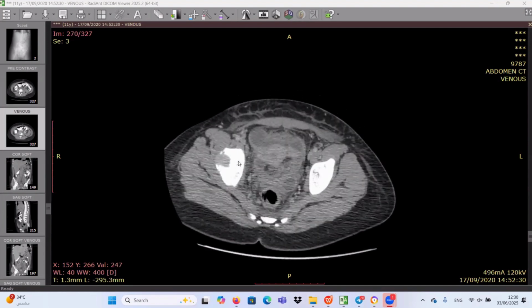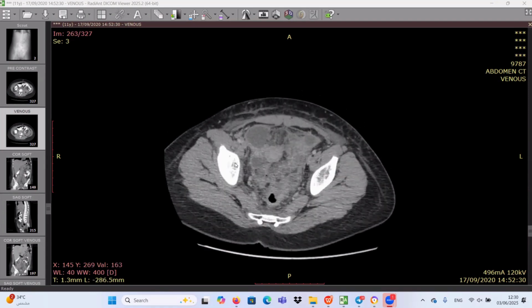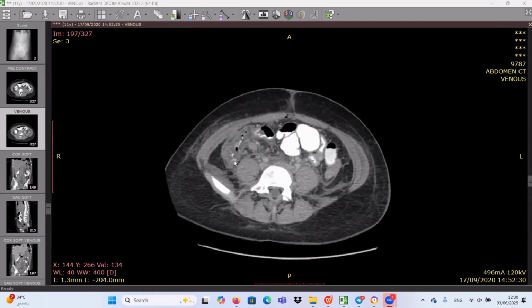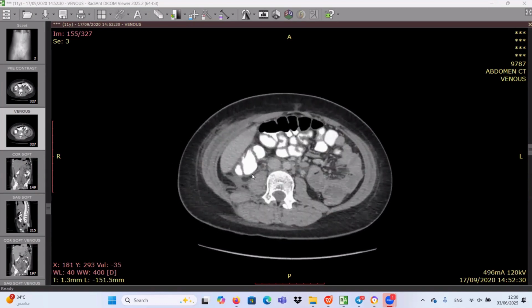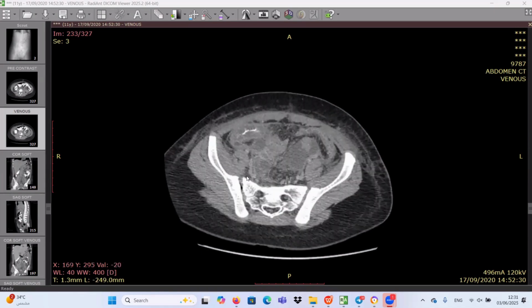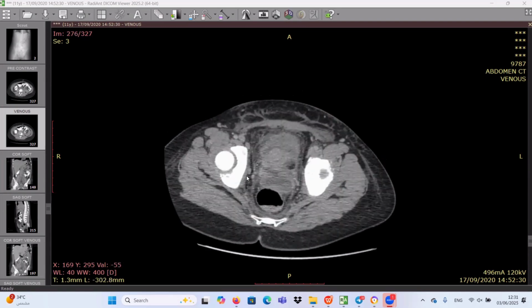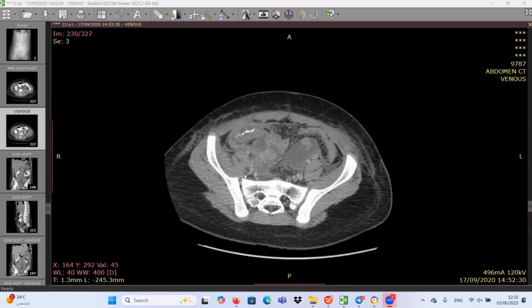Sir, I've heard that the uterus is in place, and it's a complex looking ascites, and I can appreciate a long segment thickening of the large bowel. As you said, we have a long segment of circumferential mural thickening involving the cecum and the ascending colon. Yes, sir. So, I would like to correlate my findings with the history of the patient.